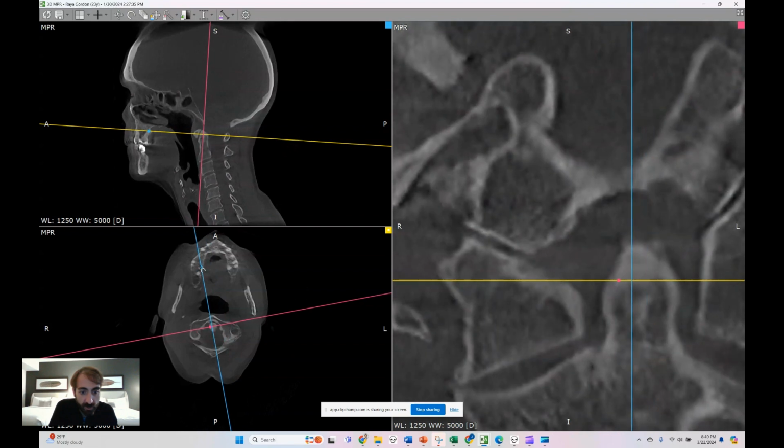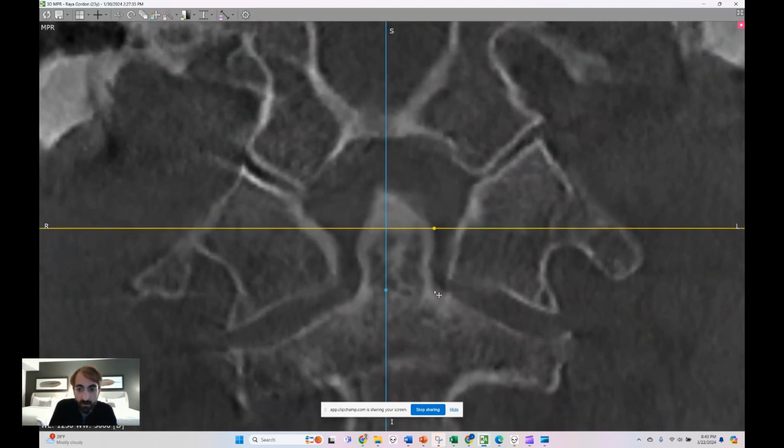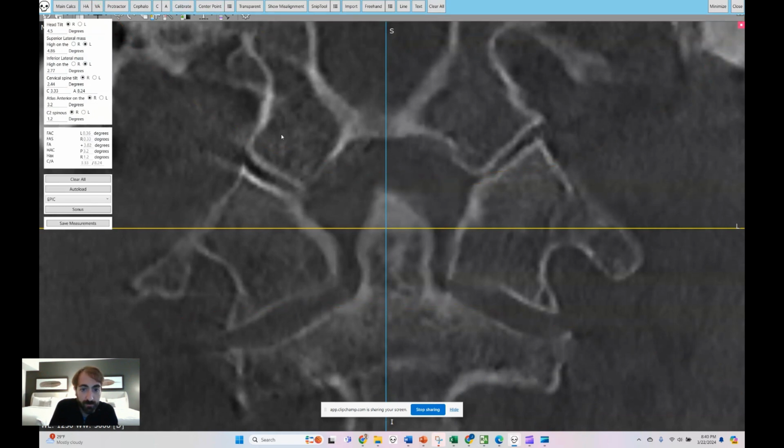If we do more of a traditional shot, this is kind of a BJ Palmer view right here. I'll do a center point on the foramen magnum, and then we'll do a center point on the Atlas. And then I just do vertical angle just because it gives me a vertical line through the two of them, and pretty close, but if anything, Atlas looks left here, so we'll keep the left laterality. But if I wanted to switch it to the right, I would just change the head tilt a little bit, and it would make it a right, but keep all of that.